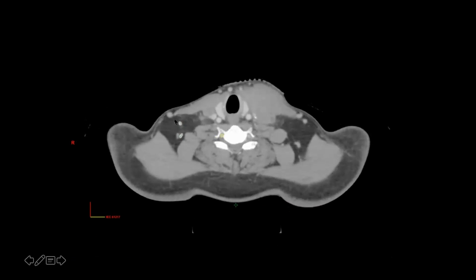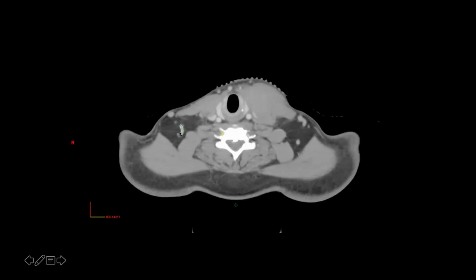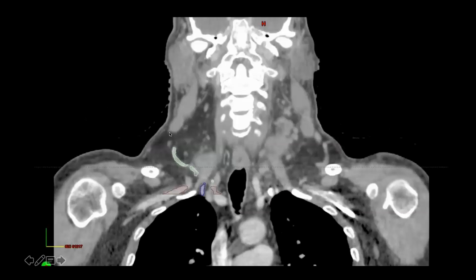See, this is the transverse cervical vessel. So it goes on and branches into the posterior triangle. So it's very difficult to know where to stop. So people randomly stop at various sites. So this over here is what I mean. So this is your level 5 territory, lateral to the sternocleidomastoid. So in this territory, you have to make sure you include the entire transverse cervical vessel.